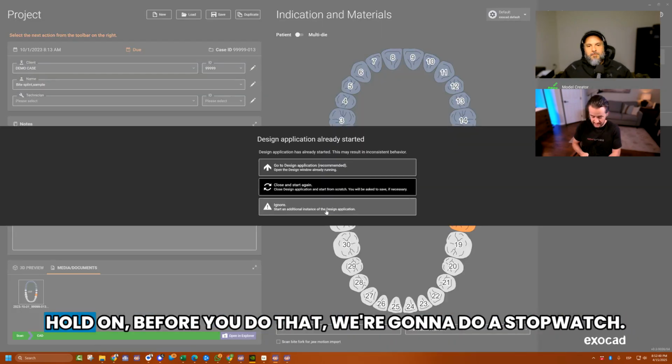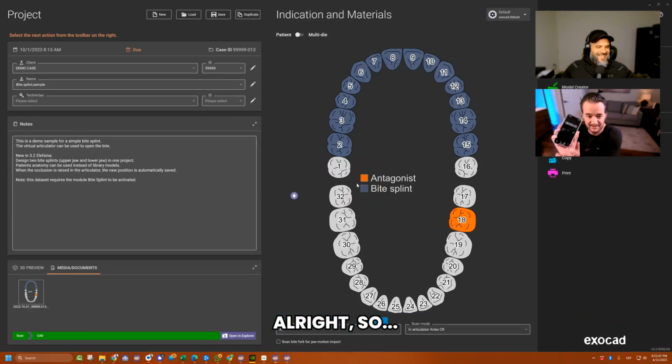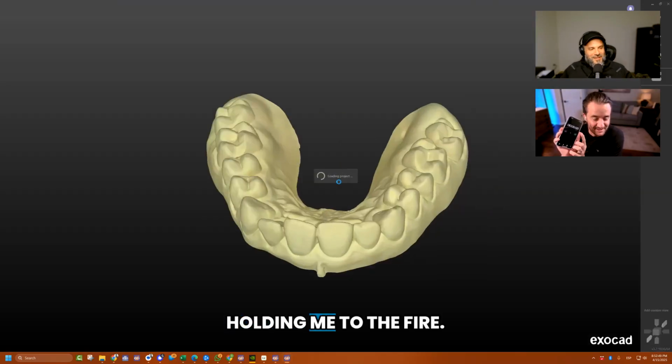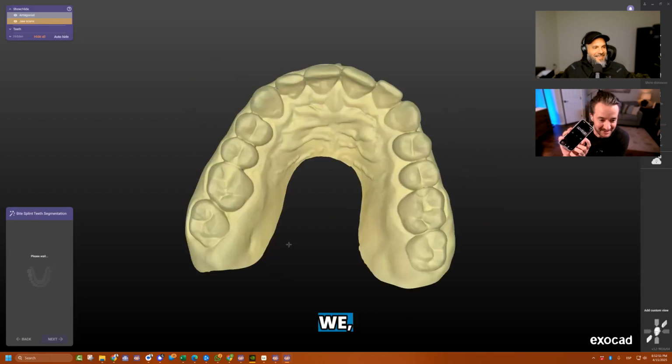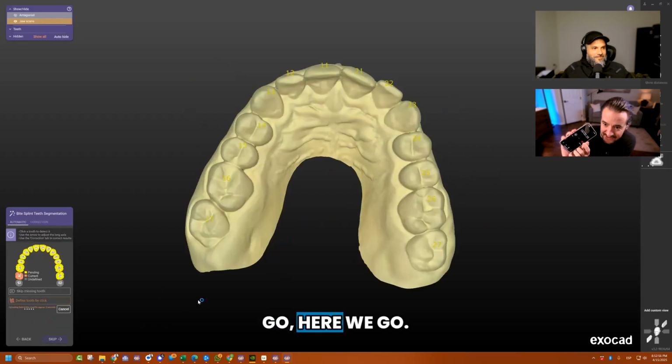Now, let me run through that without saying a single word, so you guys can see how fast the design would be. Hold on, before you do that, we're gonna do a stopwatch. All right, so holding me to the fire. I love it. So tell me when to hit the start button. Go. Here we go. All right.